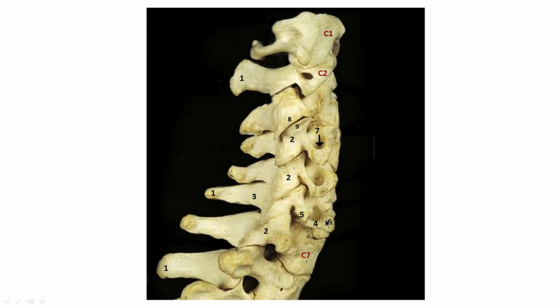Between the two tubercles, you have a space here, the intertubercular lamella, because it's in between the tubercles of the transverse process. But that's only between the tubercles. It's not the whole ball of wax here.